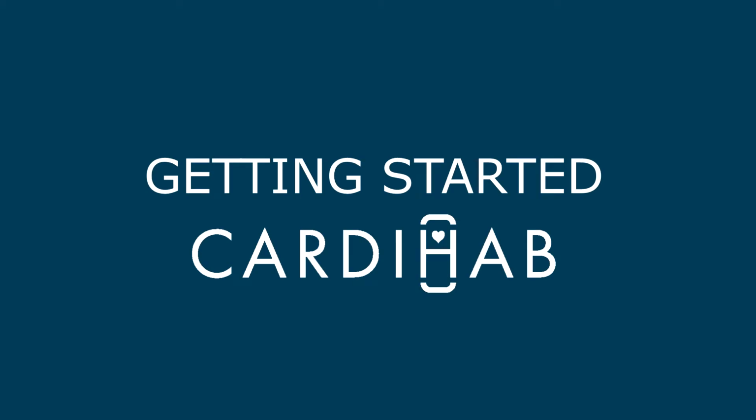Welcome to CardiHab's Digital Cardiac Rehab application. This app is designed to give patients the ability to receive more convenient, flexible, and engaging services to reach optimal health when at risk of or living with heart disease. Let us show you how to get started to download the app.